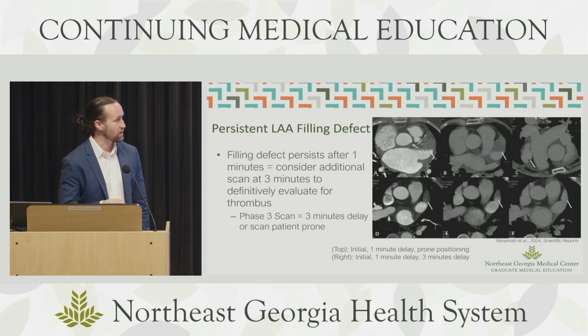So here is your initial scan at 0. Then at 1 minute, they still have this evidence of filling defect in the left atrial appendage concerning for thrombus. In the top one, we flipped the patient over and did prone positioning, so here's the left atrial appendage, or we delayed it and did it at 3 minutes, and there is no evidence of any hypoattenuation or concern for thrombus.